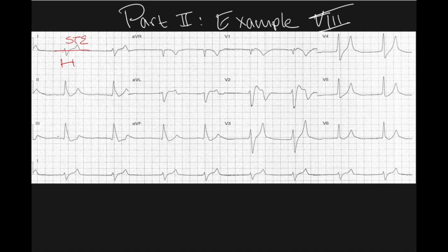right? And our T wave is positive. We have in lead 2, positive P wave, tiny Q wave. We have this odd slurring of the terminal R wave, right? And a positive T wave. In lead 3, we definitely have some ST depression. We have baby Q wave, positive P wave. We have this widened kind of slurry R wave, or QRS complex.